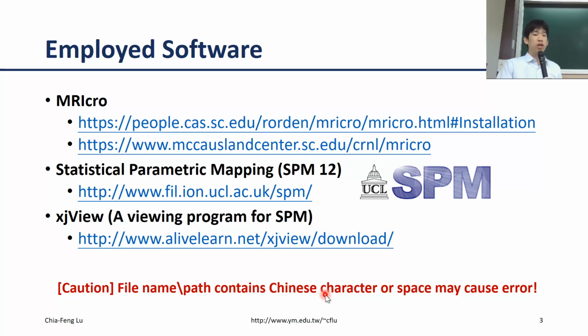So do watch out for this point. If you see a message in the command window of MATLAB saying it cannot find the specific file that you specified for the image preprocessing, then it may be because of this issue. So watch out whether you have this kind of issue. In my system, I have Chinese characters and also a space in my file path, but it worked pretty well. But I know in some old versions or some operating systems, you may have this kind of issue. So please watch out for this point.